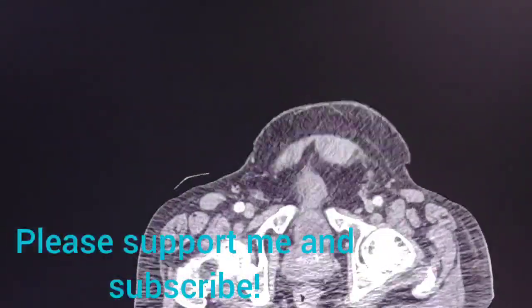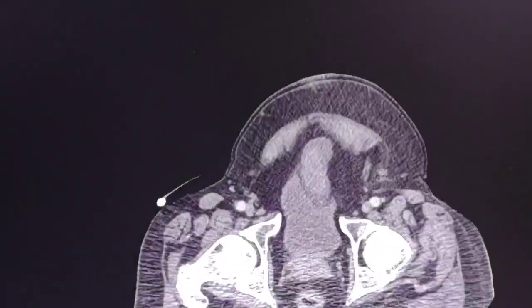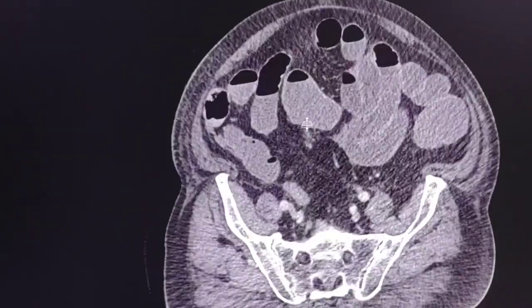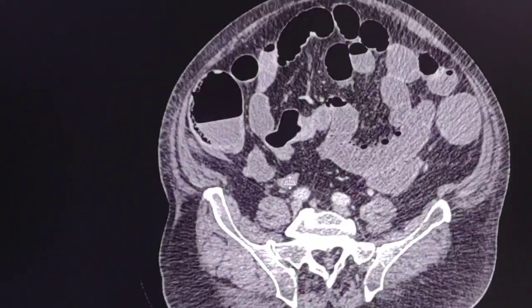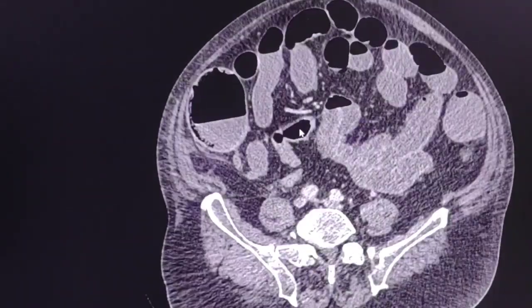The first question is: is the large or the small bowel dilated, or both? This is the first question for the approach. We usually start from the rectum, the anorectal region. The rectum is empty. That means that the obstruction is more central. So let's go and follow and track the large bowel.